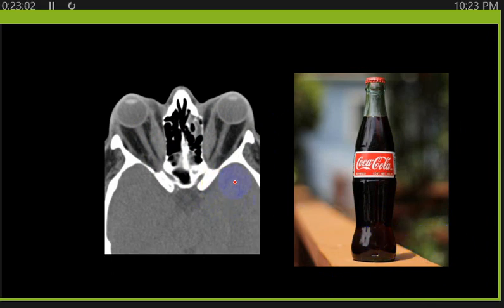Okay. Which muscle is involved? The most commonly involved muscle is the inferior rectus. I am slow: inferior, medial, superior. Inferior rectus, then medial rectus, then superior, and after that the lateral rectus. This is the least involved muscle, the lateral rectus. Okay, very good.